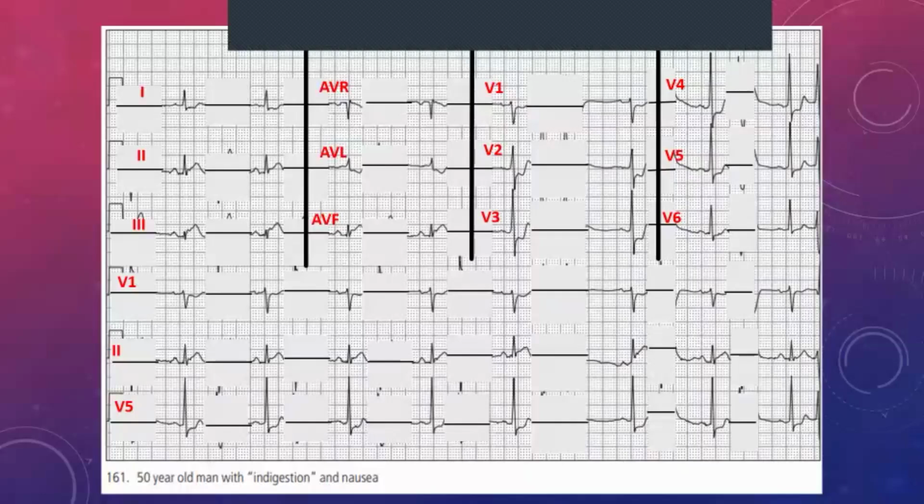Okay. Now let's look at each of the zones. So if we look at zone 2, sorry, the inferior zone, not zone 2, sorry. I was filling in a lot of forms today that had STEMI next, so I wrote zone 2 a few times. My apologies for that.